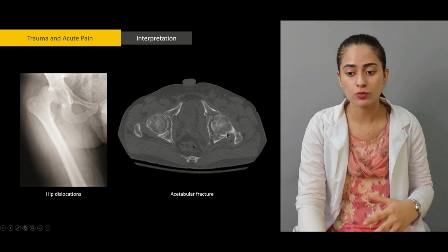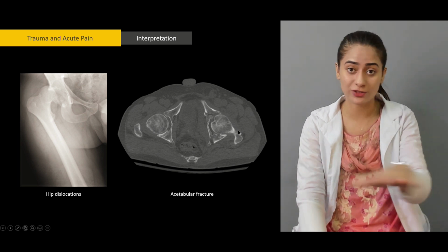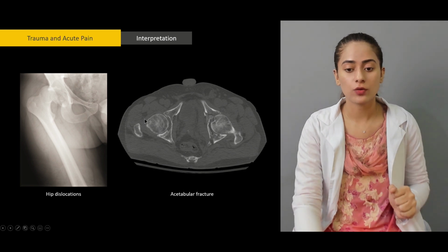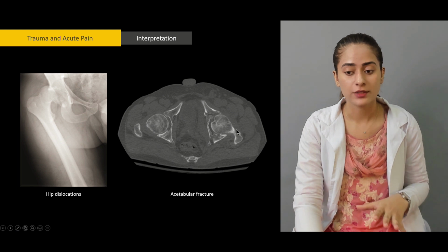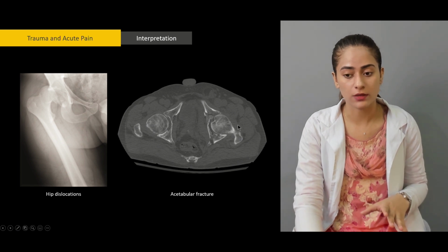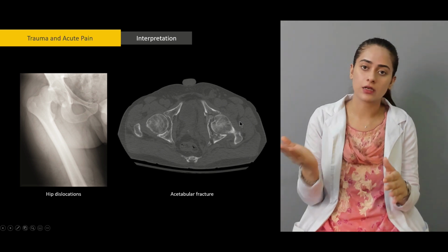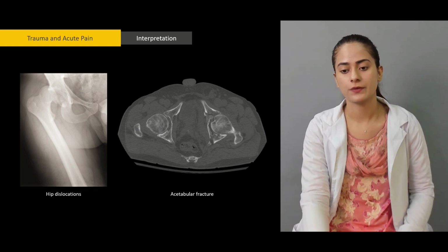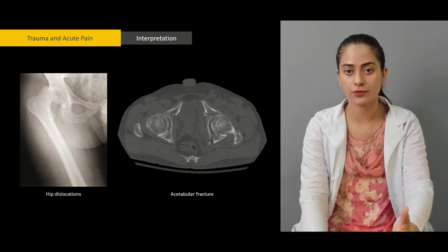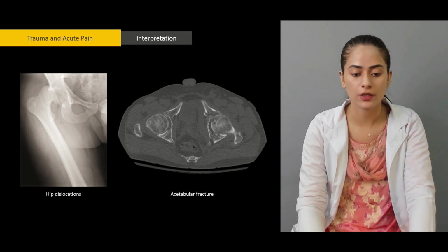When the bone has moved superiorly, the connection is visible even in this cross-section. This is normal and this is abnormal. It shouldn't be visible here; the connection should have been visible a couple of slices below. So that is the acetabular fracture and some displacement or dislocation of the hip as well.